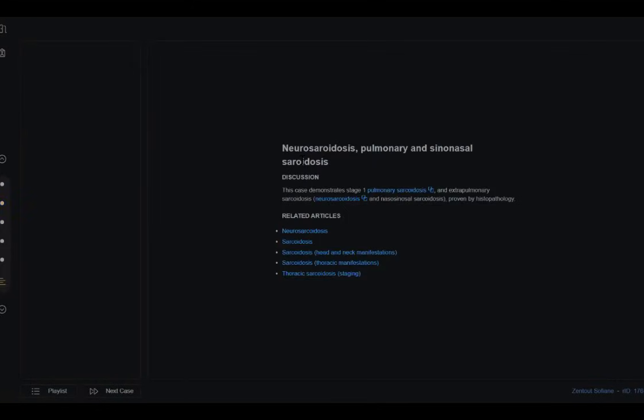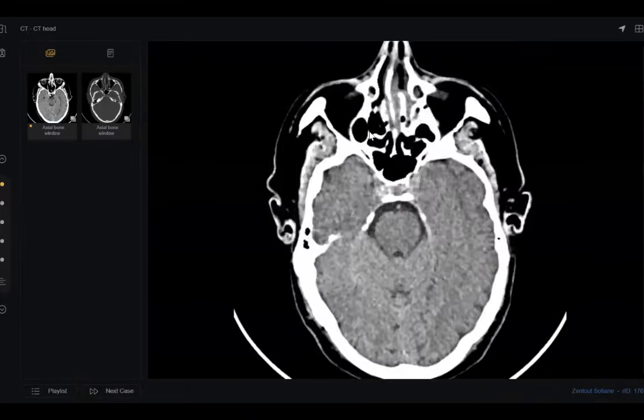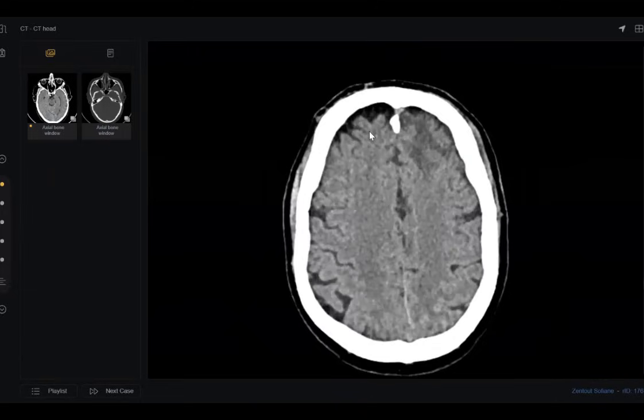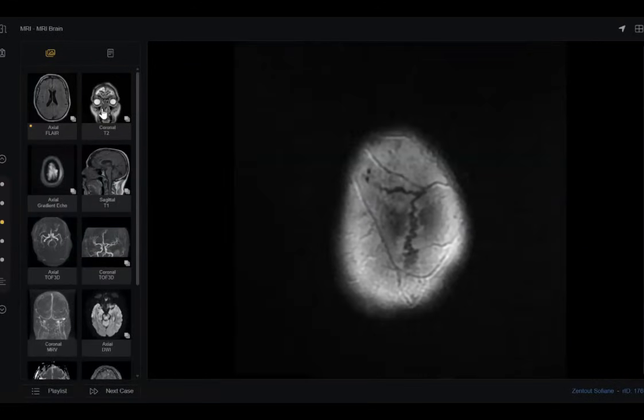It was a neurosarcoidosis. Okay, so when you ask for pulmonary CT or X-ray, you did very well. My advice for all of you, keep all the possible or the logical possibility within your differential diagnosis, as you see here. It looks like really a focal lesion, tumoral-like. But finally, even after MRI, it looks like leptomeningeal, something like this.